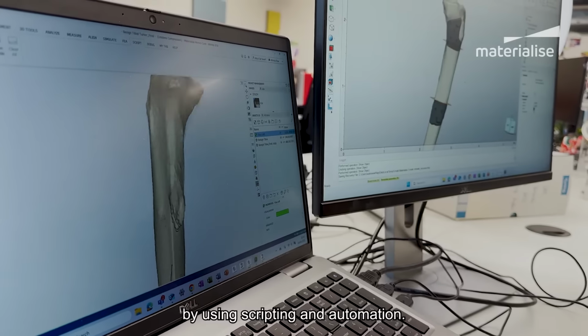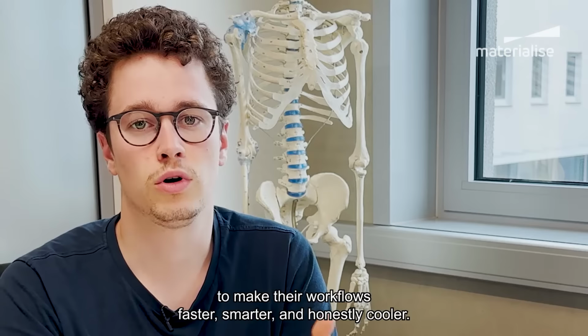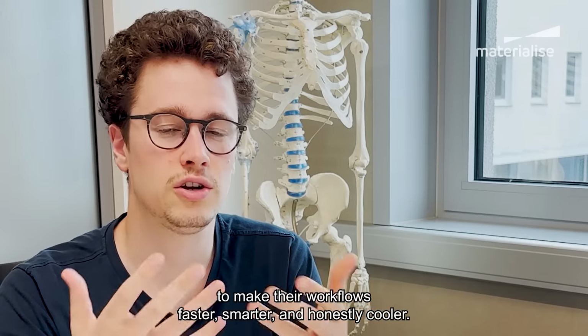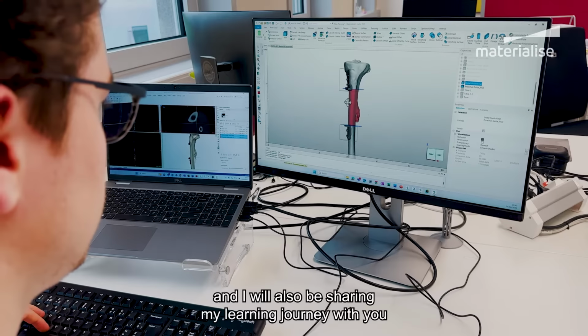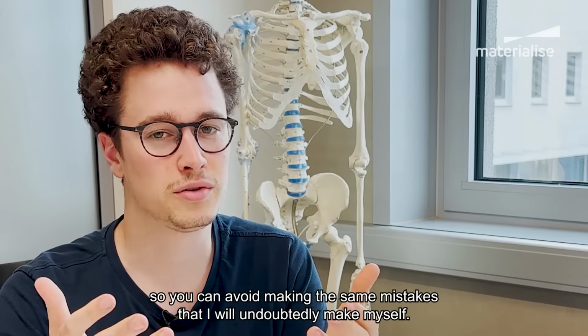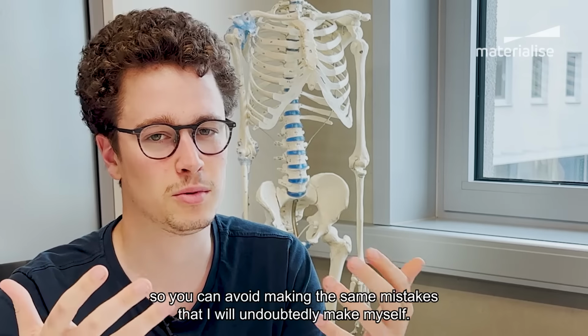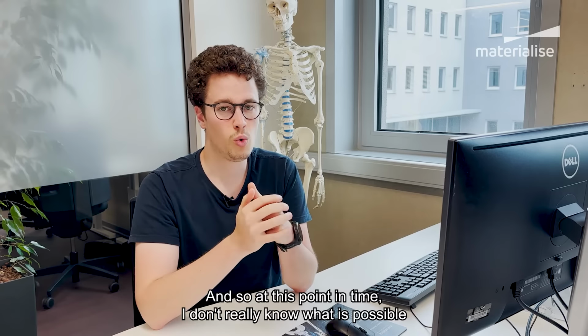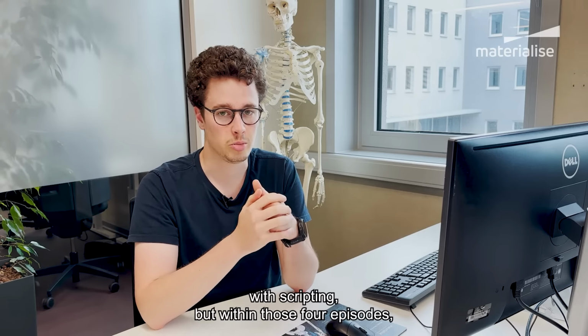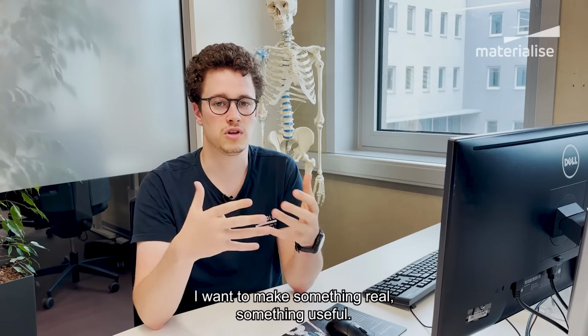Why am I doing this? Scripting is an important part of what our Mimics users do to make their workflows faster, smarter, and honestly cooler. As an application engineer, I also want to provide the best support possible for our scripting customers. And I will also be sharing my learning journey with you so you can avoid making the same mistakes that I will undoubtedly make myself. At this point in time, I don't really know what is possible with scripting, but within those 4 episodes, I want to make something real, something useful.